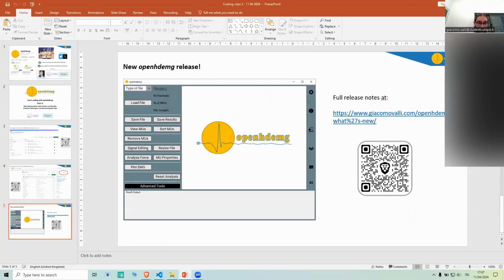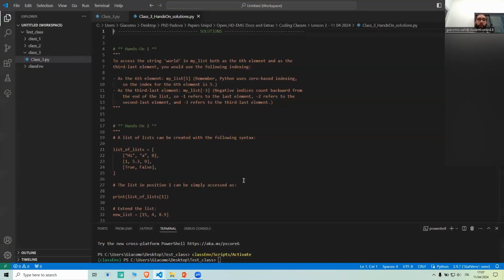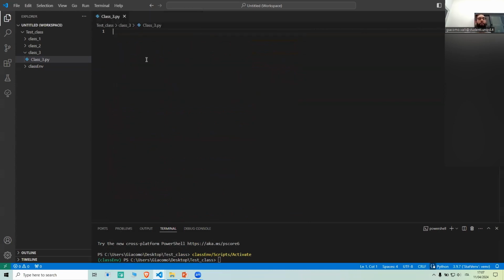Okay, the presentation is finished, so we move immediately to the code. All right, let me close this one. So today we start with data frames. Last time we saw some important, but also I would say basic properties of the pandas data frames. And today we will look at the methods, which means the functions that are part of each data frame that we create with pandas.